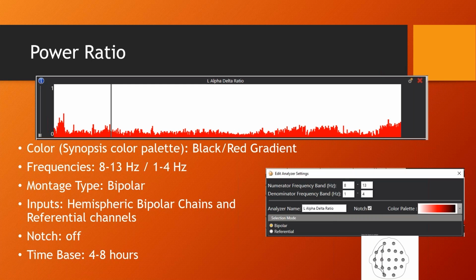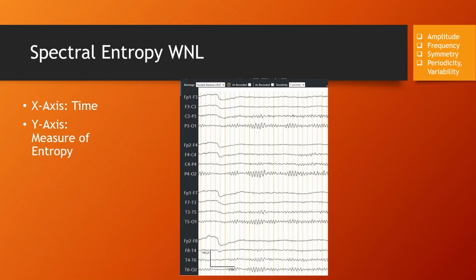Your time base can easily be adjusted. So if you were, for instance, more interested in the beta to theta ratio, you could create that and show that. On that particular one, I haven't seen any work done on that yet, but I'm sure it exists.